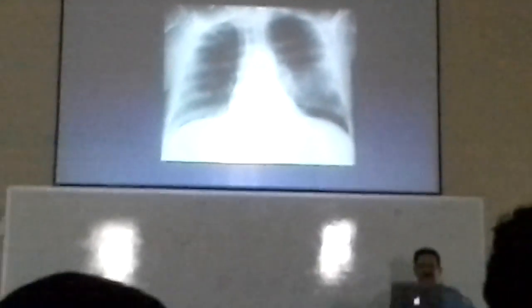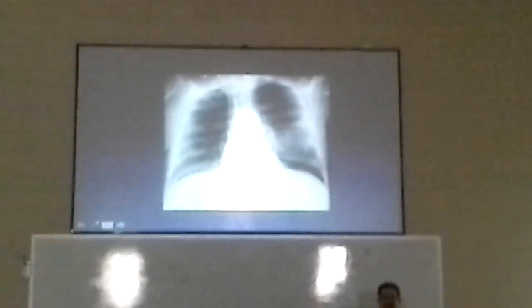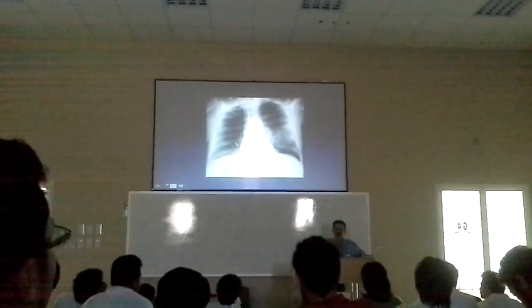Yes. What is your diagnosis? Is the problem on right side or left side? Okay, you can see the ribs here. Here you can see the ribs. This rib you cannot see. And also this hilum is larger than the right one. So there is rib destruction with hilar enlargement. So most likely this is some kind of malignant process. What malignant process, I don't know. We have to do the biopsy and see. Either this is metastatic disease or primary lung carcinoma. But on X-ray you can tell, okay, there is hilar enlargement and rib destruction.